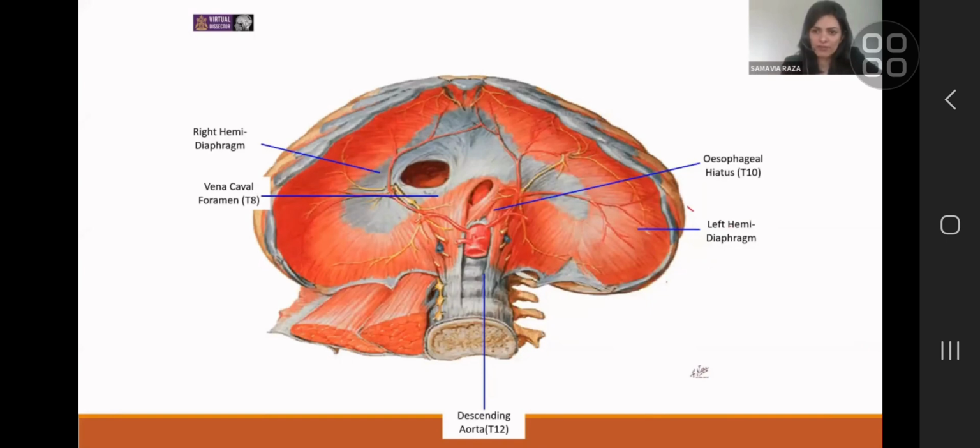It is very strong musculature that moves with every breath. It is important to remember that in strong athletic people, or people who are genetically gifted with strong musculature, and in certain ethnicities, the muscular insertion of the diaphragm can almost look like pathology.